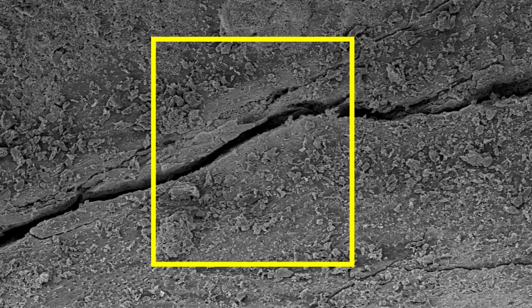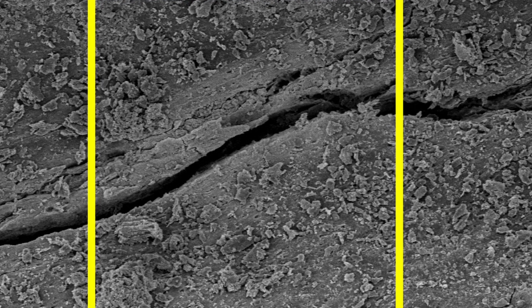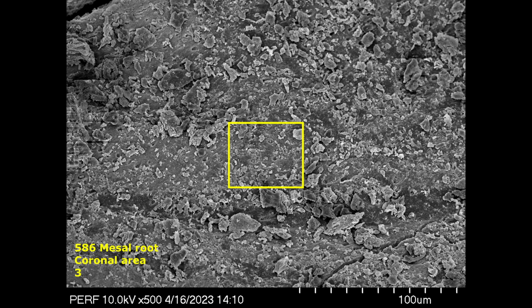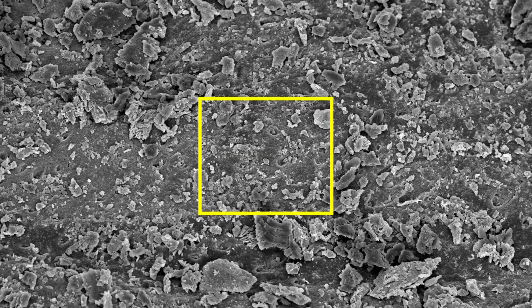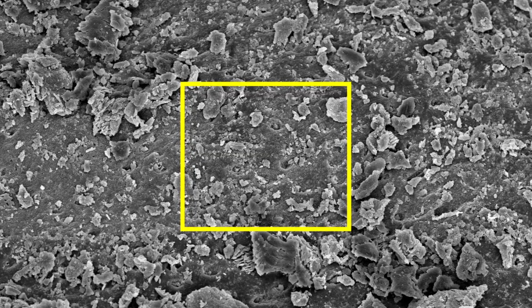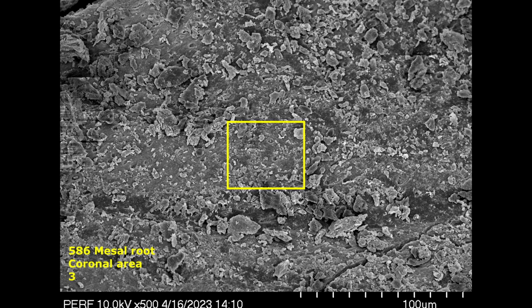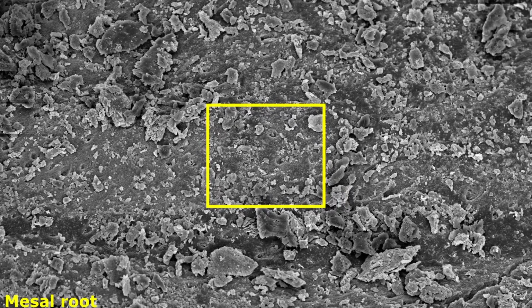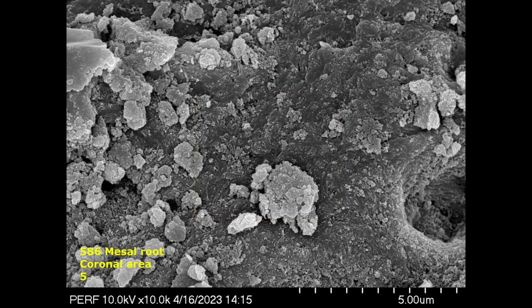You cannot make much of any dental tubule anatomy, although under the debris lies the mineralization front and it is readily discernible. In most areas in this section, there is little indication of bacterial morphotypes. If there is calcium hydroxide residue, it is difficult to distinguish this from demineralized predentin, demineralized smear layer, or instrumentation debris. When you can examine the dental tubules, it is clear not enough demineralization has taken place to discern the collagenous nature of the intertubular dentin. My suspicion is that the peritubular dentin is still present and has not been demineralized.